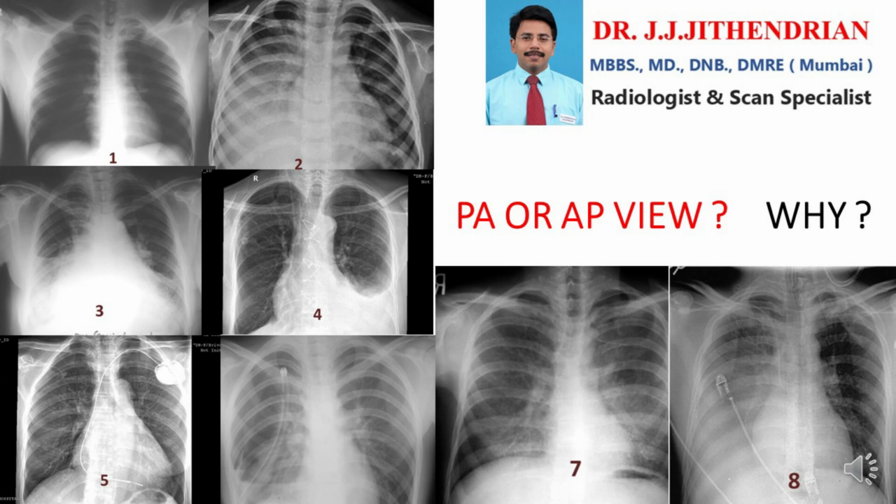Hello everyone, I am going to give 8 images of X-ray chest and the question in each is whether it is done as X-ray chest PA view, posterior-anterior view, or as X-ray chest AP view, antero-posterior view. And please think about the reason why you say that.